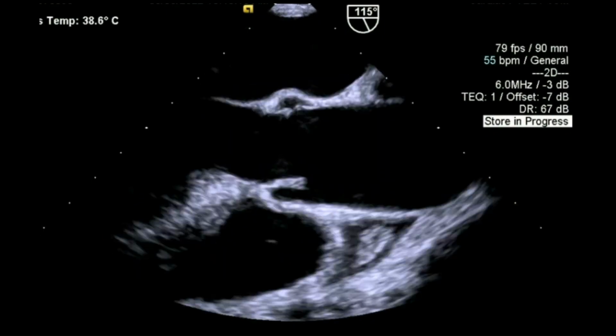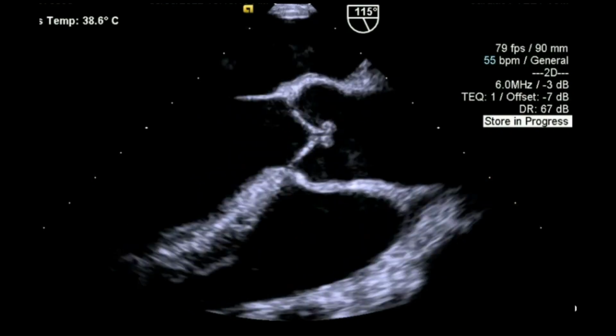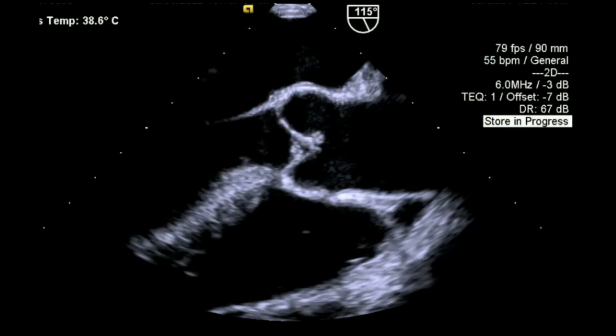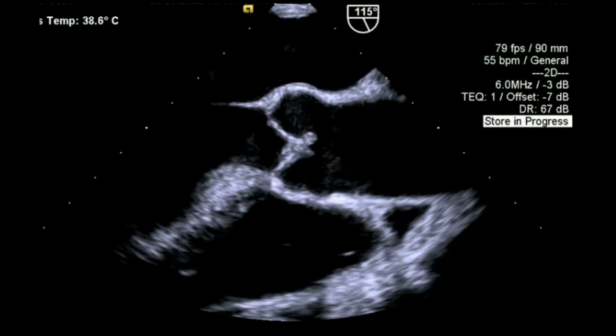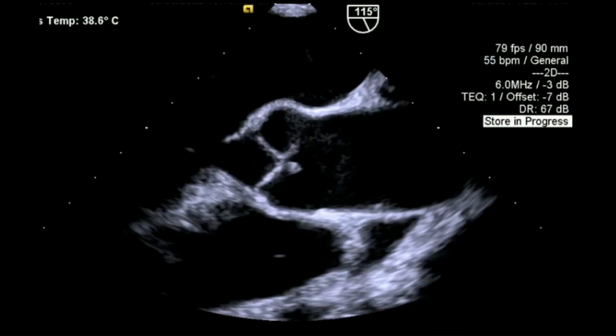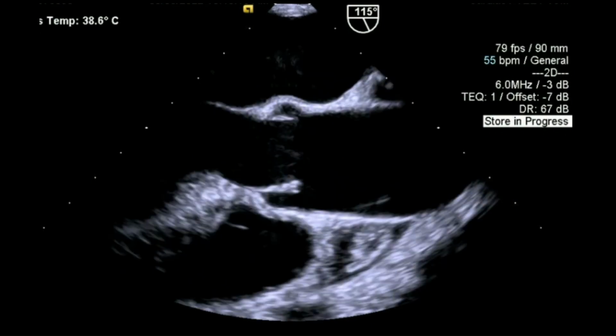Next, I have the transesophageal images, in which you can see the leaflets a lot more clearly and nicely. So we can here see from the equivalent of that long axis view of the valve, again that morphology of the leaflet tips, which just has an abnormal closing appearance.